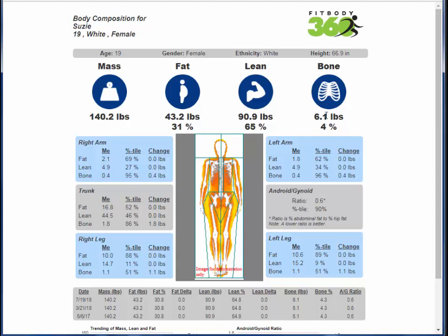In this video, we have demonstrated how easy it is to transmit scans from the enCORE software to FitTrace, as well as how the process of scan reception works.